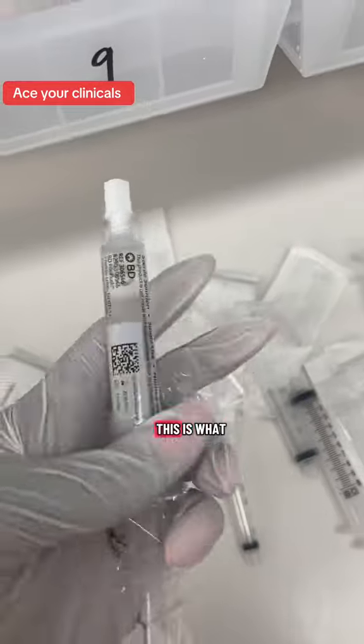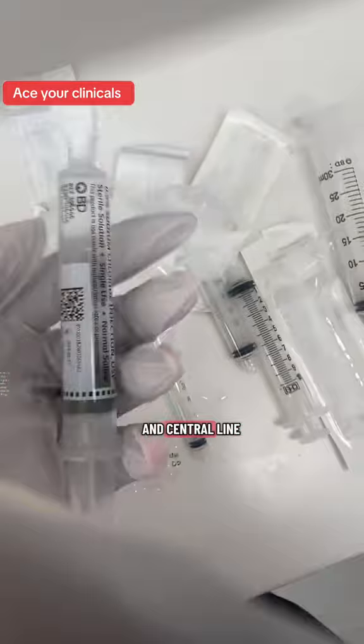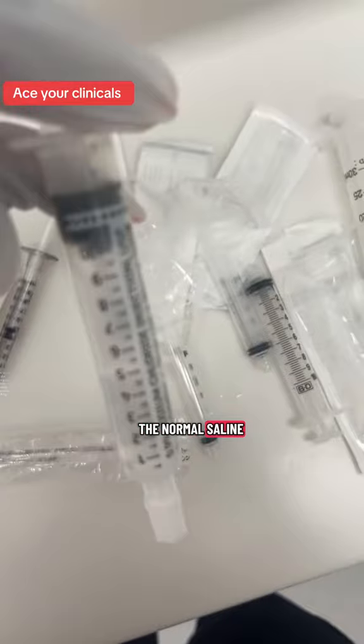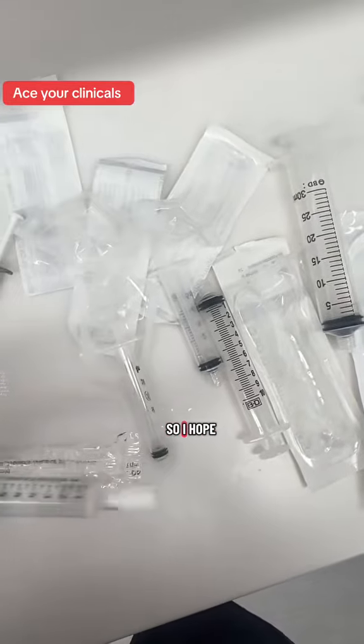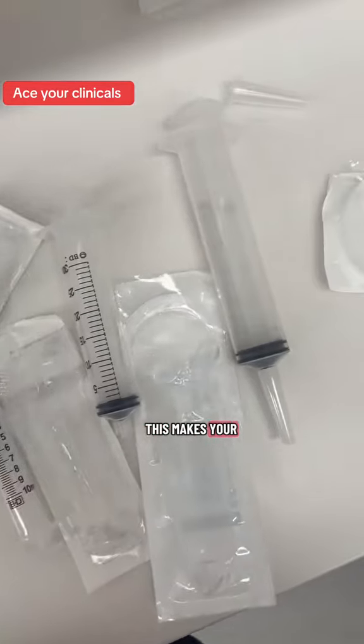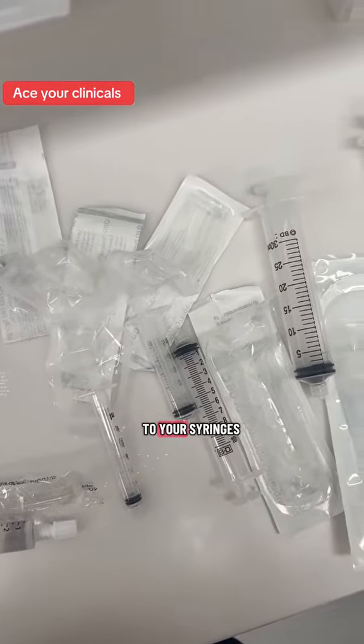We have this. This is what we use every day to flush in and out our patient's IV and central line. And this is the normal saline. It comes in the 10 ml. So I hope this makes your clinicals easy and you get used to your syringes.